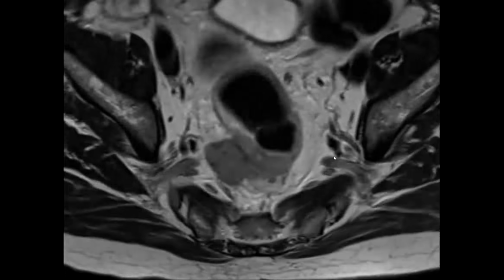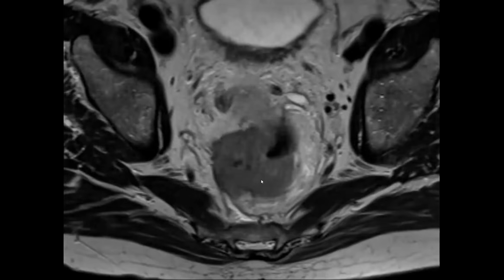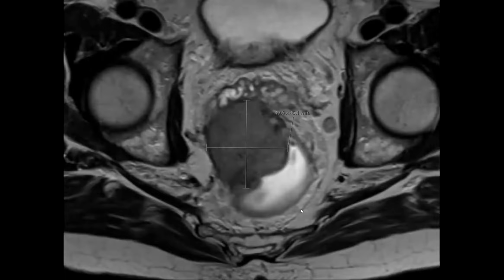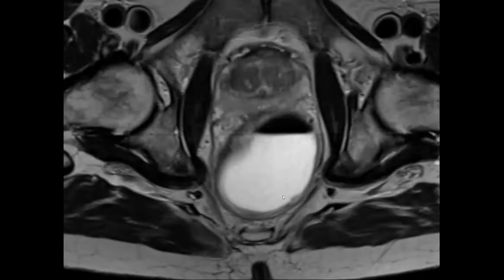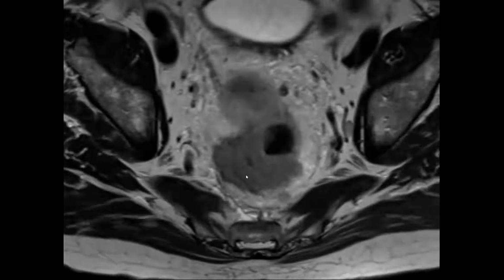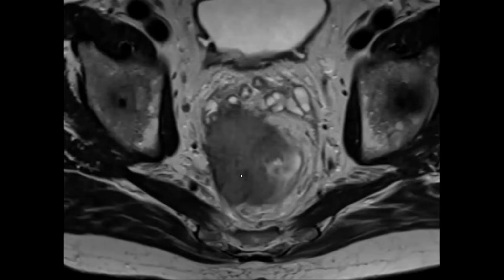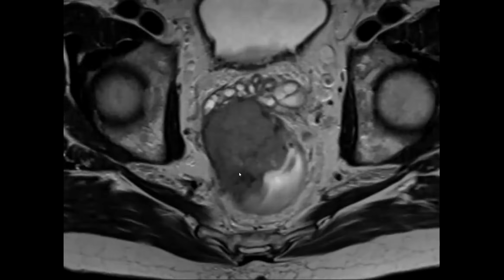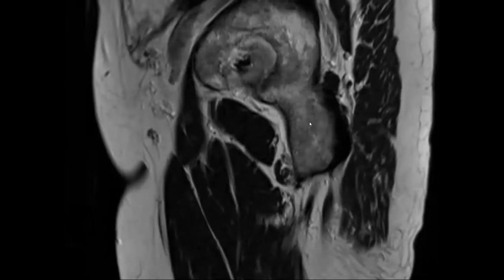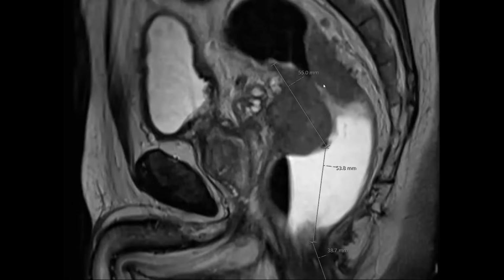Okay, we've got a high resolution T2 of this. Rectosigmoid or some kind of mass. Where is it coming from? Yeah, it looked like it was coming from the rectal wall. We were referred, they said rectal mass. So we did a rectal staging protocol. I'll show you. Here it is. It was pretty high up.